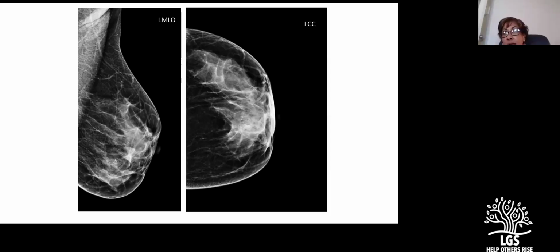even though you don't really see it even on MRI, what I usually do for MRIs is lower the threshold for the CAD overlay. I don't know if you use CAD color. Yes, we don't have double reading on mammograms, so we do use CAD. Most of our work is diagnostic mammogram. So I'm talking about the MRI, because that'll show the invasion of the nipple, that it goes towards the nipple. So he would say you cannot conserve the breast.